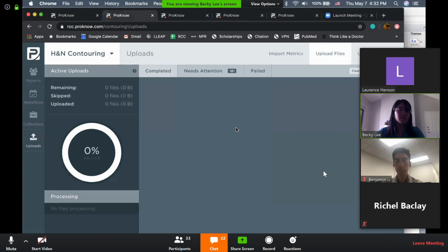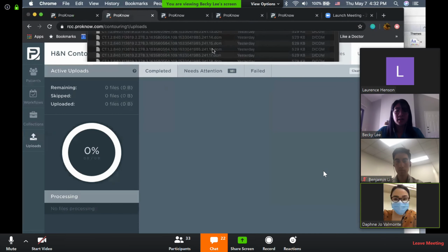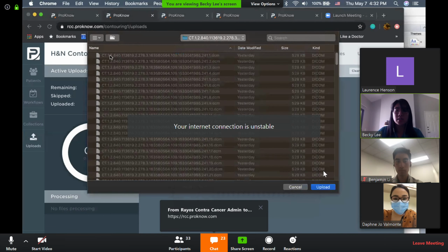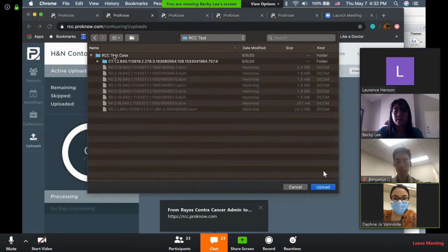And most of the time, all of the folder, I'm going to go ahead and upload directory. And I actually have a test case for this. And then I can go ahead and just click on test case and then upload it.